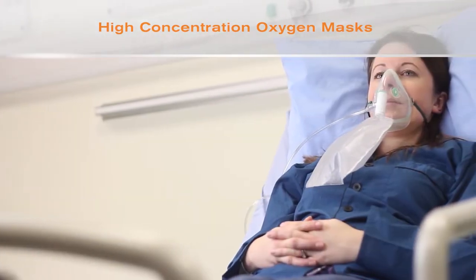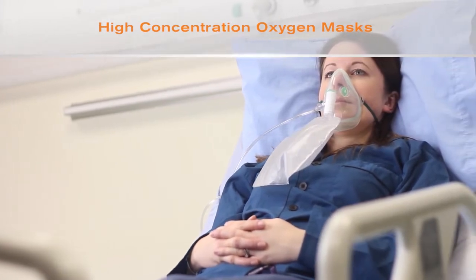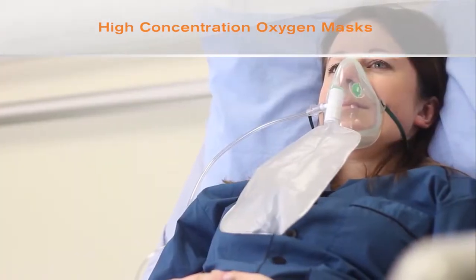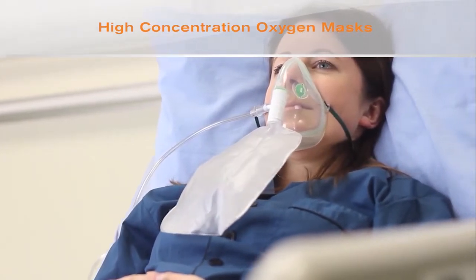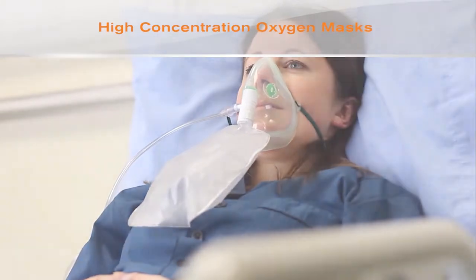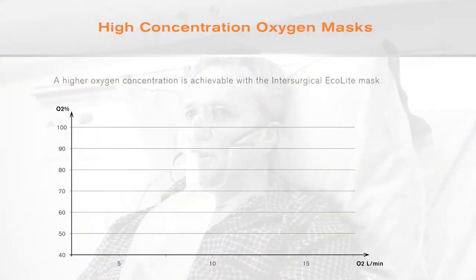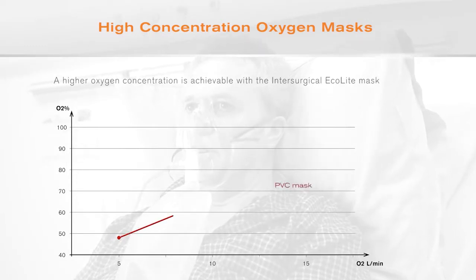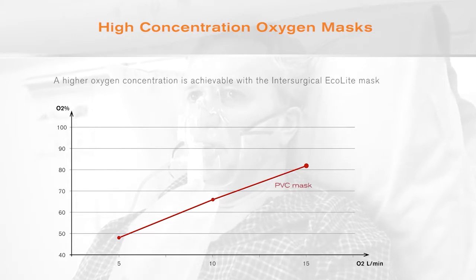Ideally, the patient does not breathe any room air. However, the fit of the mask and the patient's breathing pattern will affect the amount of room air entrained and the oxygen concentration delivered. Limitations of the mask fit associated with older mask designs meant that high concentration oxygen masks delivered up to 80% oxygen with flows set between 10 and 15 litres per minute.